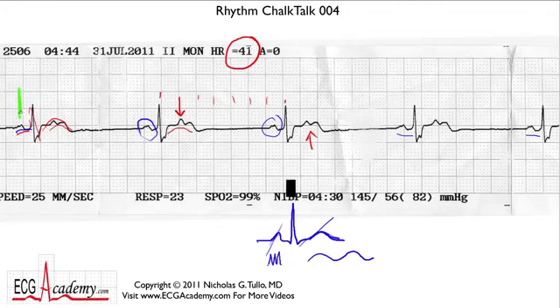And if you take this P wave and you take the next P wave and you measure halfway in between, indeed, there is nothing there. And so you might say, well, there's no P wave here, but maybe we got the P wave rate wrong. So let's measure from this P wave to this one. Where would the next one fall if that was the atrial rate? Well, it would fall in here someplace, and then maybe have another one over here.